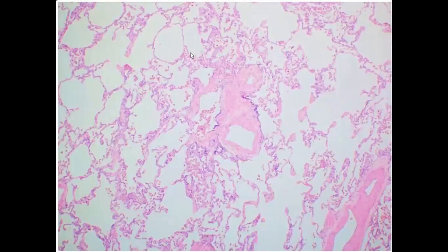So discussing the microscopy, as we discussed in our histological algorithm, first on low power we have to look whether the lesion is diffuse or patchy. On this low power we can see that the lesion is present here, while the adjacent alveoli are a little bit expanded, but there is nothing in the lumina. So the first thing is that the lesion is patchy.